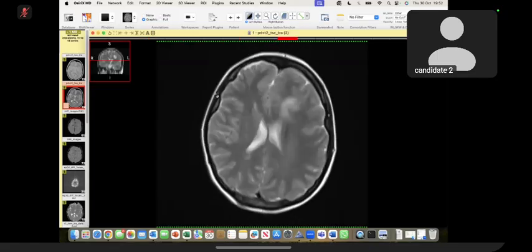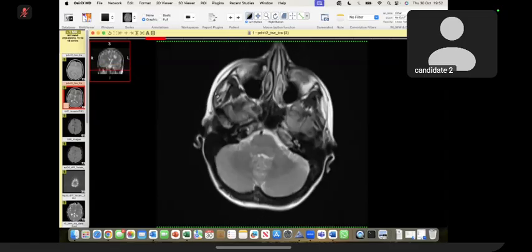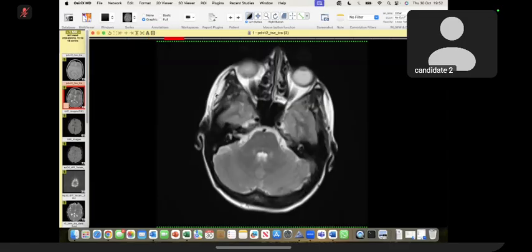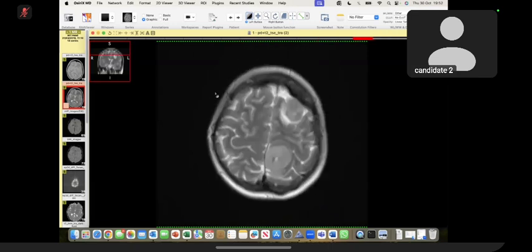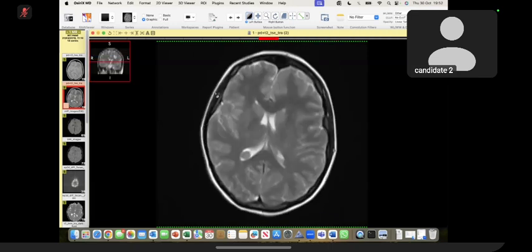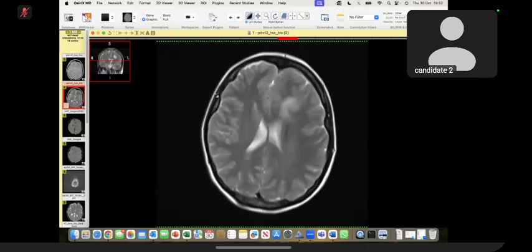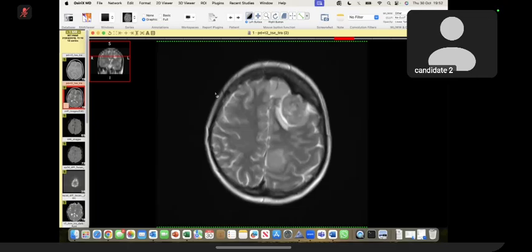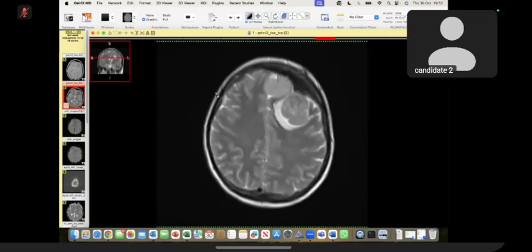So these are multifocal, intraventricular as well as extra-axial, predominantly left frontoparietal region, altered signal intensity areas appearing to be iso to hyperintense on T2 with surrounding CSF cleft around the larger ones, causing mass effect on the surrounding structures, but I could not appreciate any hydrocephalus.